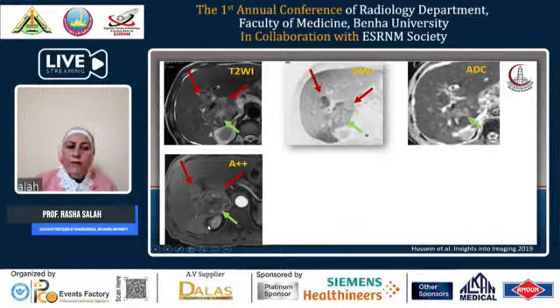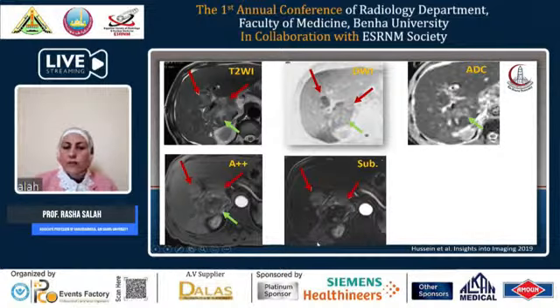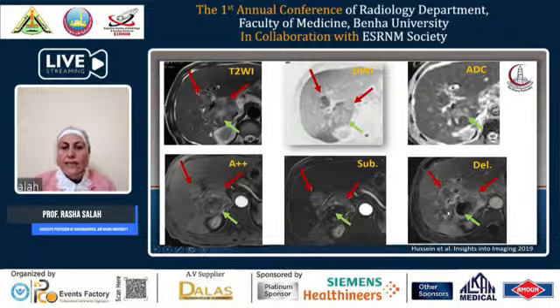However, there is a wedge-shaped area of homogeneous enhancement located posteriorly, and this wedge-shaped area of enhancement is just due to adjacent peripheral inflammation and perfusional change as a post-therapy change, and it was persistent till the delayed image. However, the residual viable tumor shows early enhancement that was proved on the subtracted image and followed by washout on the delayed image. And this is how we can discriminate between post-treatment enhancement and the actual residual tumor.